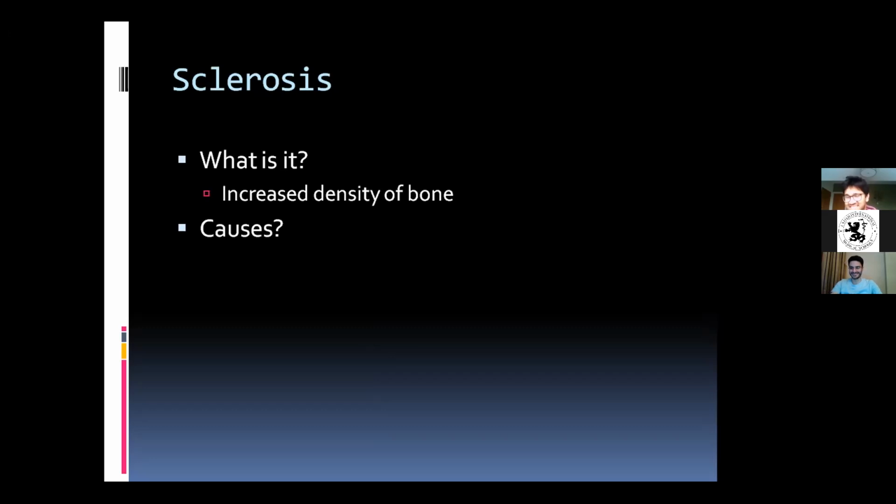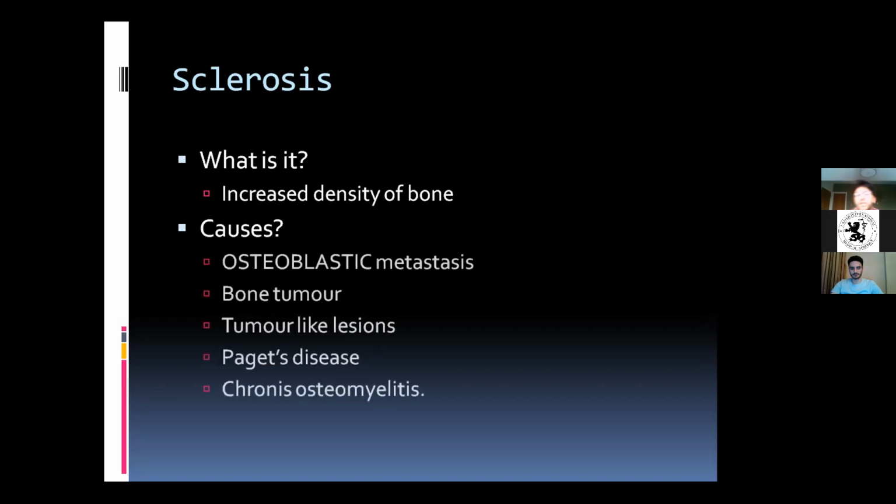Well, there's definitely one type of disease. Oh, okay, yeah, fine. I know the one you're talking about. Paget's disease, excellent. There's also another one, Ewing sarcoma, but other primary bone tumors as well. Exactly. And here we go. So these are the broad category of conditions that can cause sclerosis to the bones.